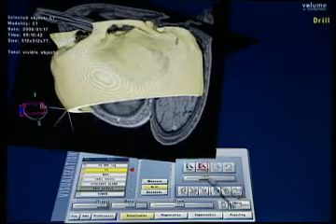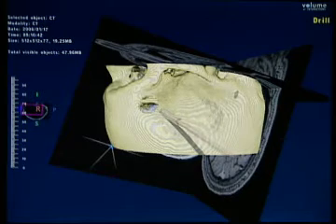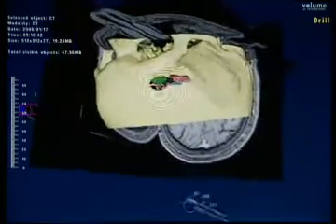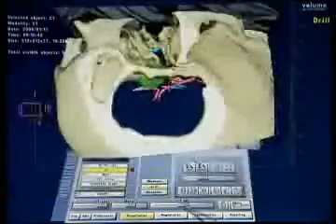So positioning the patient a little bit. And I can adjust the size of this. I want to have it a little larger than we would usually have it. So we are making a burr hole behind the temporal line. Yeah. And then we are taking that craniotomy over the supraorbital rim. Now the interesting thing is we have limits medially, of course.